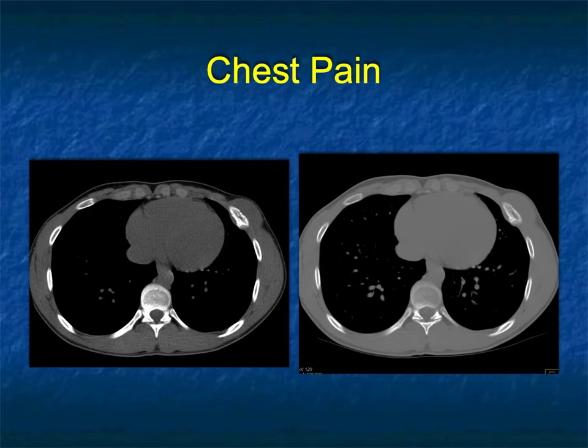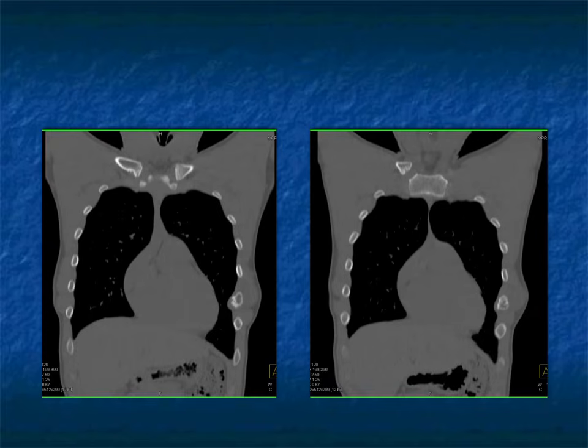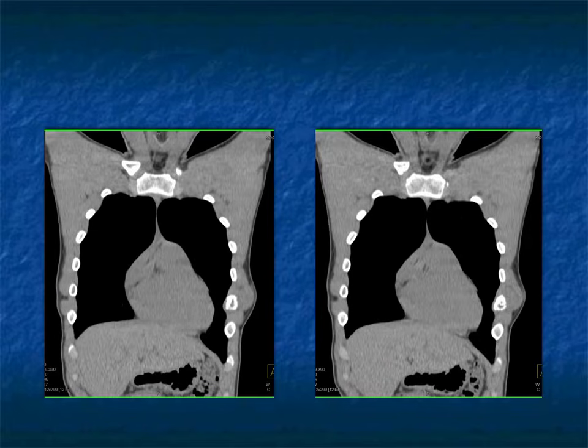Chest pain. There's a lesion, 6th rib on the left. There's bone destruction and soft tissue mass, which you can see. If the patient had trauma, that could be an explanation. If the patient had infection, usually it's more pleural based. You can get things like actinomycosis, but it doesn't look like infection in the bone. It looks like infiltration, but I couldn't rule out infection totally. When you get more images, you really appreciate the soft tissue mass that's present. You appreciate it especially on the coronal and 3D coronal images, very nicely shown.